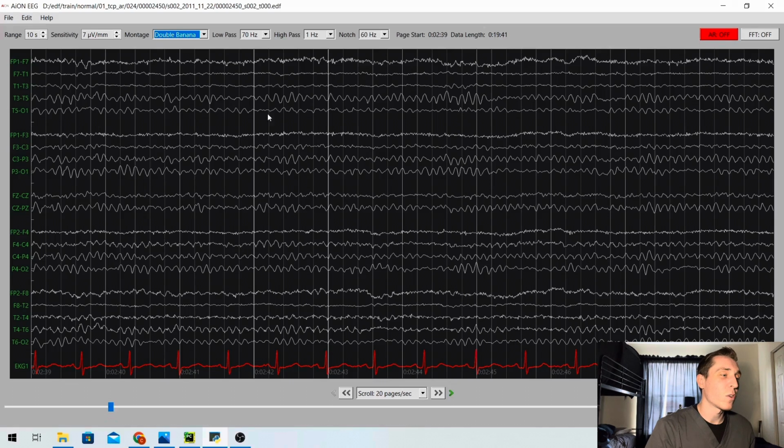So this is a normal EEG that you can compare to, but in a person with a brain tumor, like we were talking about in our example earlier, in the left occipital region, look for O1, odd numbers for the left side. O1 would be only like 5 per second instead of this 10 in the normal EEG. So what happens when a person has a brain tumor on the EEG?